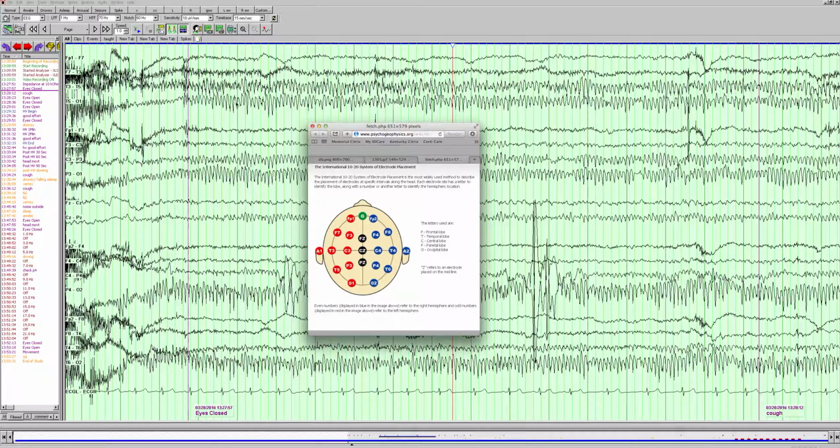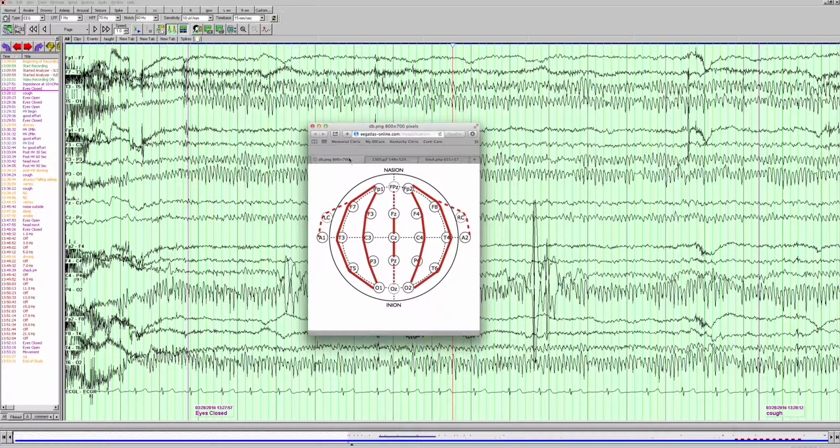We look at these electrodes on the EEG as combinations, and we see electrode chains that are the potential difference between 2 electrodes. And that's how we always look at electrical activity. It's the difference between 2 electrodes. And we look at these chains as a combination of different electrode combinations called montages. This is a montage that is used very frequently, and it's a very good screening montage. It's called a double banana montage because it looks like 2 bananas on either side of the head.